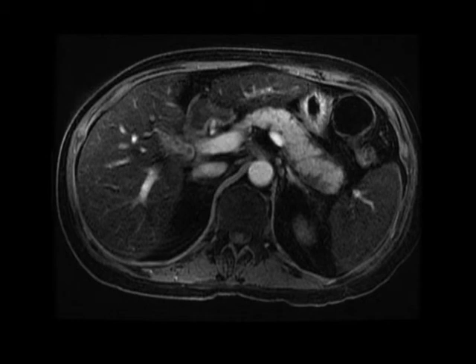So one of the entities that I've become increasingly aware of over the last 2 or 3 years is autoimmune pancreatitis. Now, this is an entity that I think most of us as radiologists weren't that aware of as recently as 4 or 5 years ago, and all too often I think we were either missing the diagnosis completely or we were misdiagnosing these patients with run-of-the-mill edematous pancreatitis.